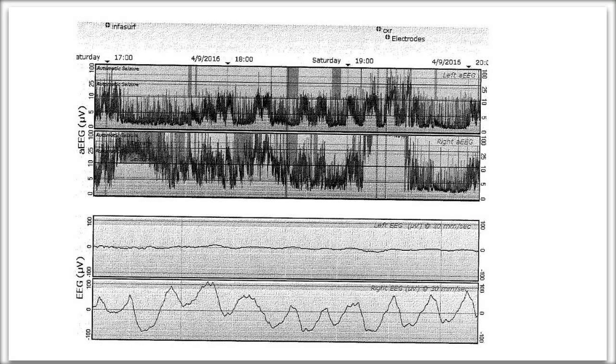So I asked this person who sent this to me to send me also the impedance. And I was not clear whether or not they were actually using needles or hydrogel. So that always is an important feature to understand, what is the background impedance before you get too far into your interpretation. So at the very top, we see there's these little notations.